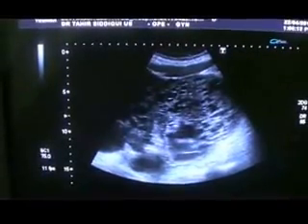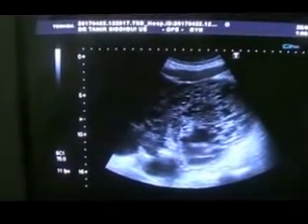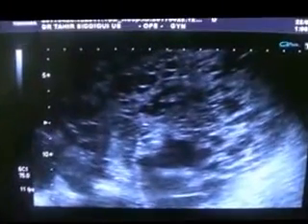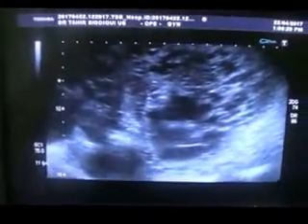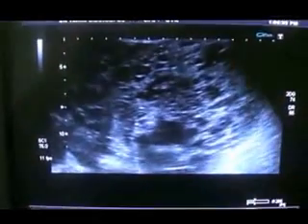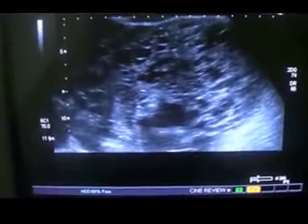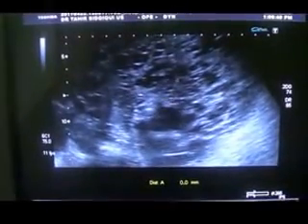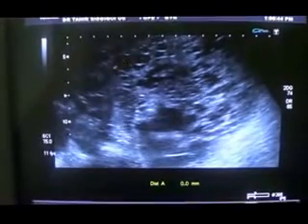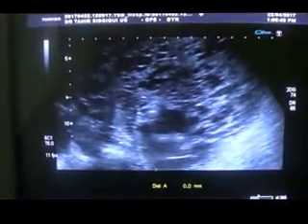Now this finding is consistent with Mucinous Cystadenoma, and here I show you the magnified view. In this magnified view, you can see this is a mass sort of giving a mass picture. However, this is not a mass. These are all gathered together septa, you see, within this cystic area. So this is our case of the day. Thank you very much.